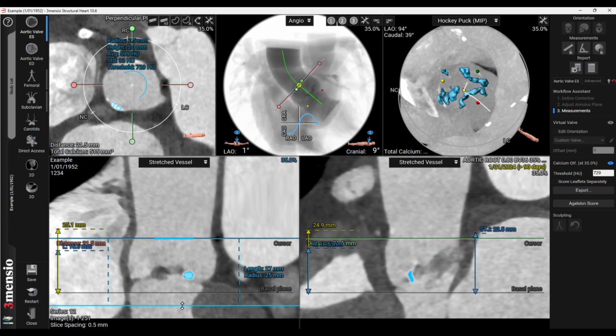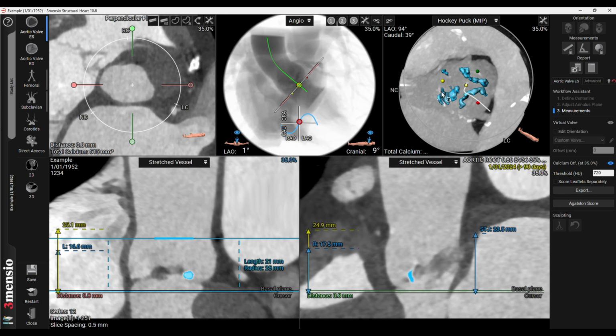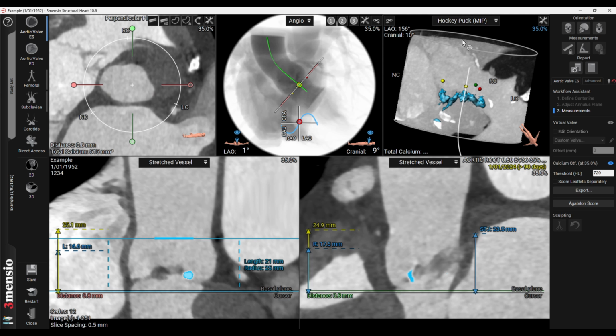Also, you can get interference from patients that have prosthesis. So anything like stents or pacemakers, anything like that can also affect it as well. So you have to keep that in mind.